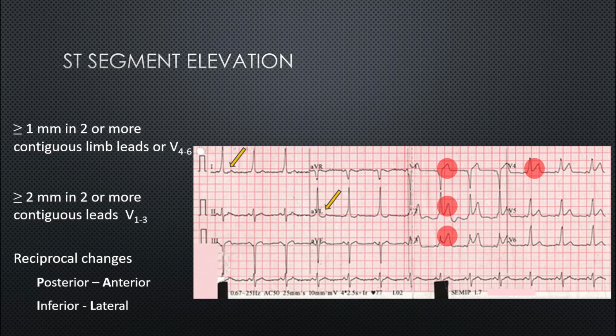Most of these events are going to reproduce a repolarization variant that alters the position of the isoelectric line by making the resting voltage more positive within the damaged area. Now, this is most evident as repolarization occurs, making the ST segment appear higher than the baseline in the unaffected regions. As it is specific to the damaged area, it's going to produce these regional rather than global ECG changes.